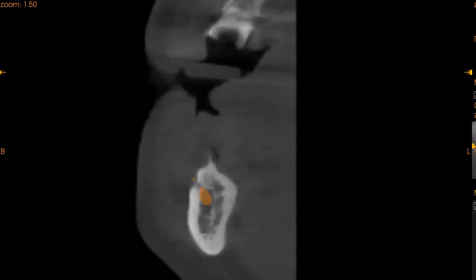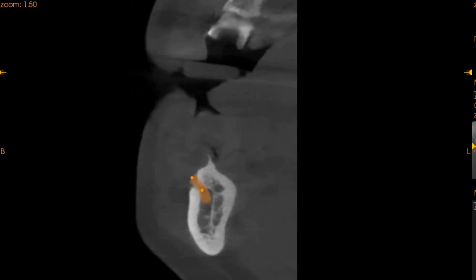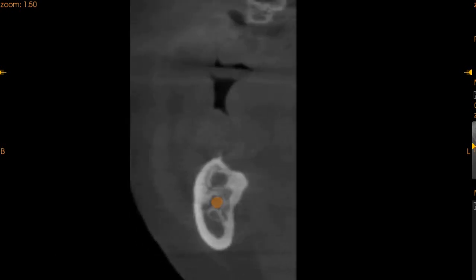In the first premolar region, we again have a very thin ridge. If this can be alveoloplastied, we've got 5 millimeters of width with approximately 10 millimeters of height. Moving on, this is the mental foramen. As you can see, the inferior alveolar nerve and the mental nerve has begun. In the molar region, again, we've got good ridge width, 5.5 millimeters with only 6.8 millimeters to the inferior alveolar nerve.